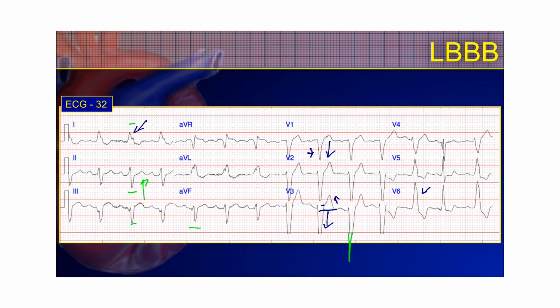And again, you'll also get ST depression in the presence of a left bundle wherever the QRS complex is upright, as it should be in V6. You'll get ST depression because that T wave is negative and the QRS complex is upright. The T wave discordance drags the J point in the direction of the T wave. Okay, remember that rule, and it's going to be pretty easy to identify these STE-Mimics.